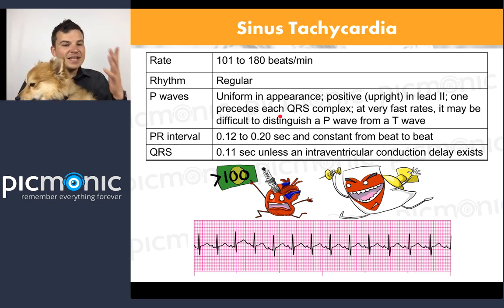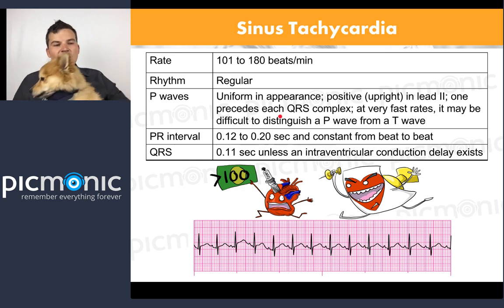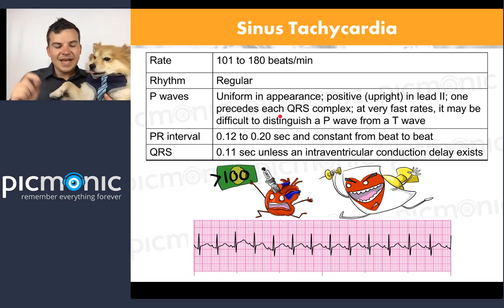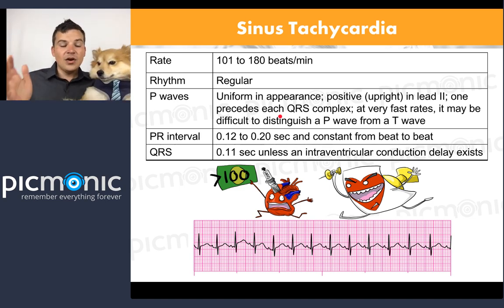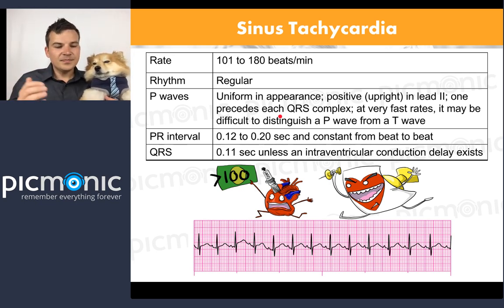And it means it's a tachycardic rhythm. So you say tachycardia first. Then when you look at, and you say regular, yes. Then we say P waves. There's one before every QRS. That means it's sinus tachycardia. So then we've added tachycardia. Now we say it's sinus tachycardia. And that's how we know exactly what it is.